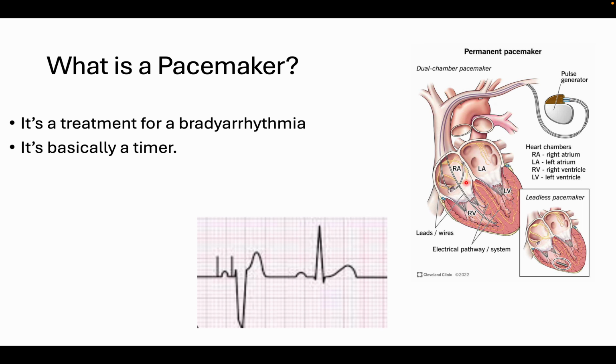However, if you do not have intact atrioventricular conduction, that paced atrial beat will not be able to pass down to the bottom of the heart, and so the right ventricular lead, which sets its own time limit for waiting for intrinsic ventricular conduction, will expire, and once that timer expires, the ventricular lead will stimulate the ventricular myocardium, generating a pacing spike and a ventricular paced beat. And then the whole cycle restarts again, and the timer restarts again.